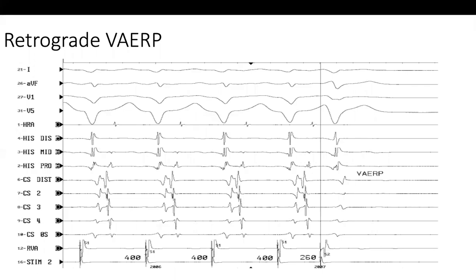Dr. Sharafuddin has a question. Dr. Ahmed, can you call this orthodromic AVRT? Well, this is during pacing, so you cannot call it. Without pacing it can be, or just leave it as accessory pathway, because you don't have surface ECG during sinus rhythm and during tachycardia. Orthodromic and antidromic describe the conduction of the accessory pathway and the AV node during tachycardia. This is not during tachycardia.